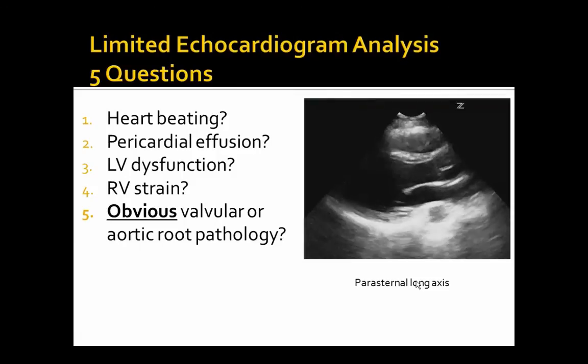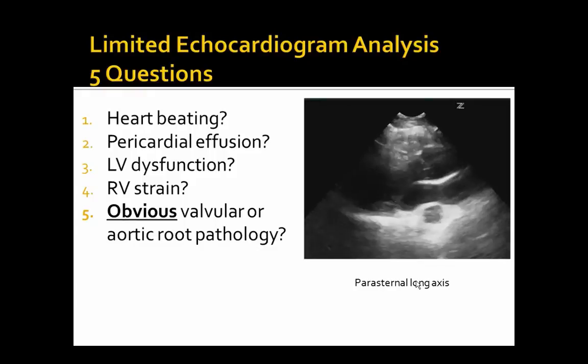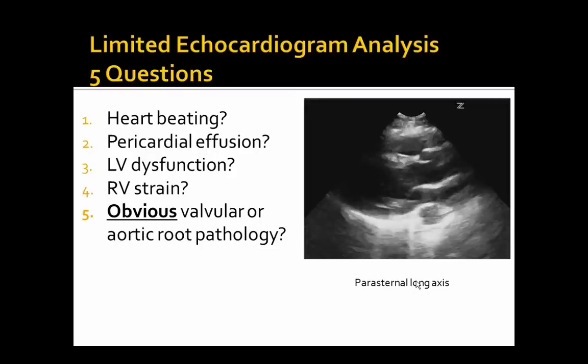All right, those are the views we're going to do. Those are the ones we're going to talk about. So let's go back to those questions. Question 1, heart beating. Just take a poll. What do you guys think about this one? Is it beating? You think about that.